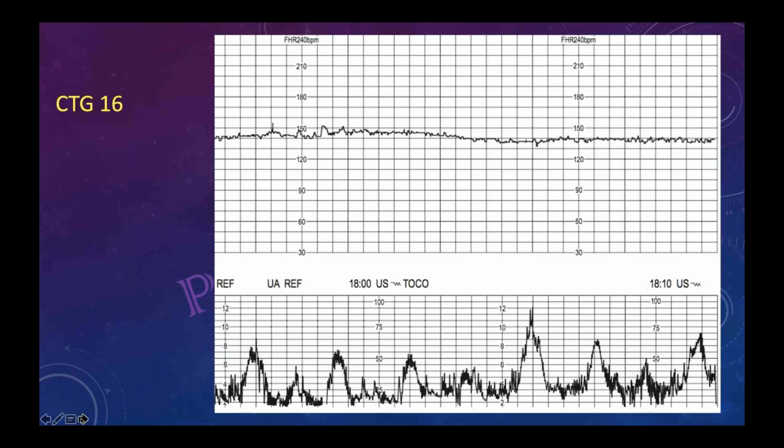Okay. So Muntaha was doing. Yeah, Miss May, basically it's a 10-minute CTG. There are almost 3 contractions in 10 minutes, and the baseline is around 140 with no accelerations, no decelerations, and variability is more than 5. So it's a normal CTG.